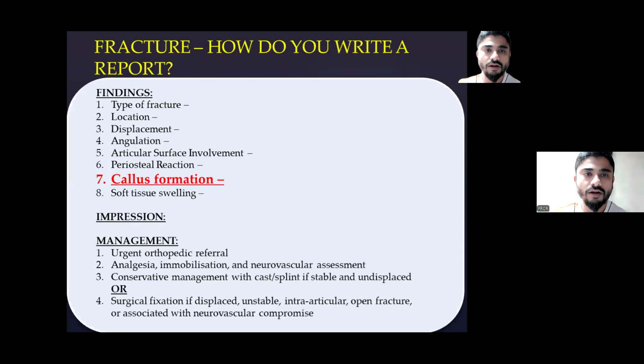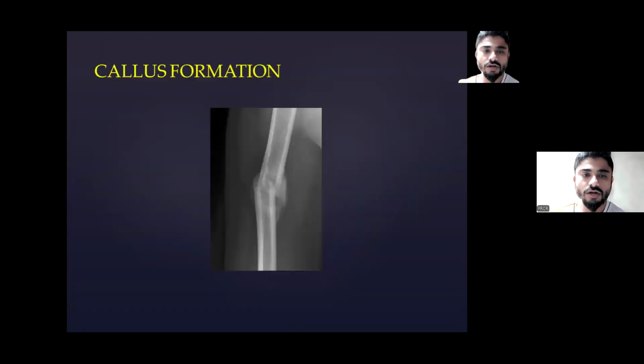Okay, now coming to the callus formation, whether there is any associated callus formation or not. So this is how the callus formation will look on the radiograph.